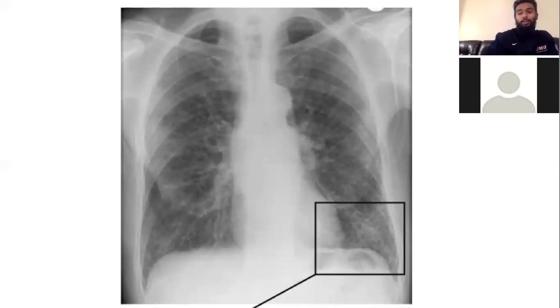But one thing is that with fibrosis, it's worse in the peripheries. And because the lungs are fibrotic, normal structures like vessels or hard borders, which are supposed to look nice and clean, don't. It's not like in consolidation, where I said with the silhouette sign you can't see the borders. You can still see the borders, but they're almost fuzzy. Normally the lungs provide a clean black ground for all these structures. Lungs are supposed to be black, but because of fibrosis, it has a little more whiteness to it, like the mesh.